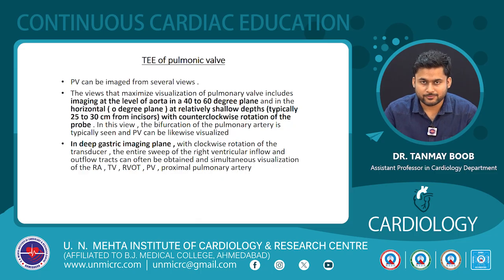The third view is the deep transgastric view. For this, we have to do clockwise rotation of the transducer and the entire sweep of RV inflow and outflow can be visualized, with simultaneous visualization of the right atrium, tricuspid valve, RVOT, pulmonary valve and proximal pulmonary artery.